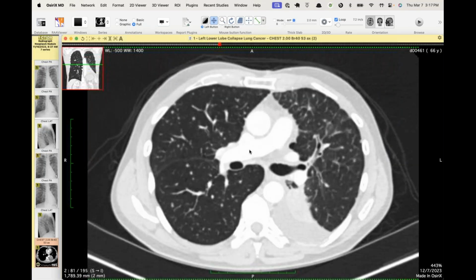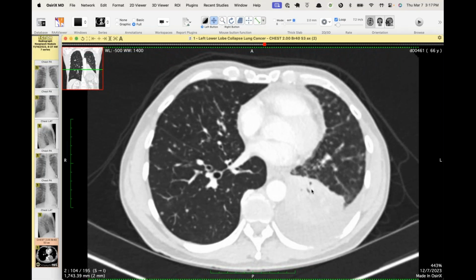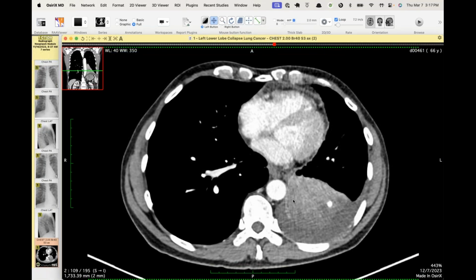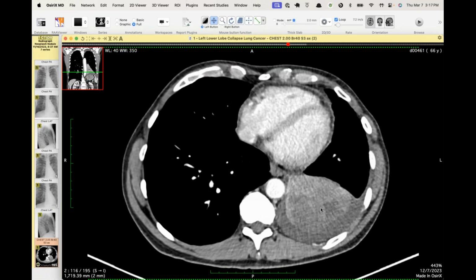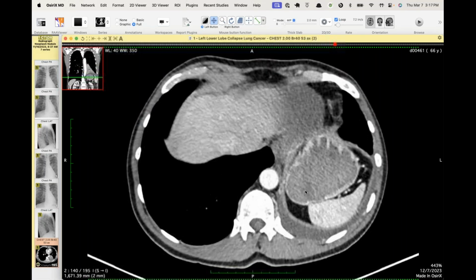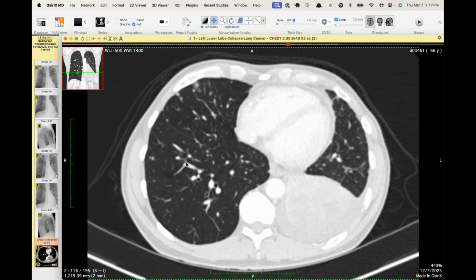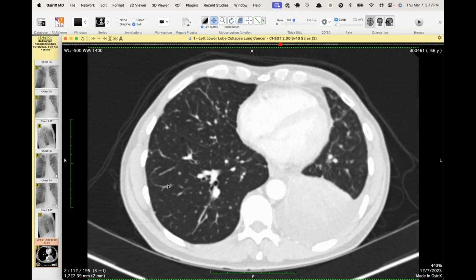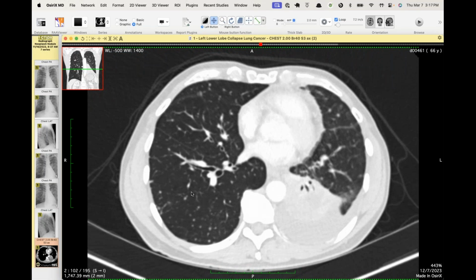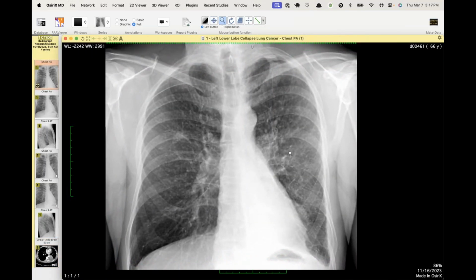One of the things that's a little interesting here is the lesion isn't actually obstructing the left lower lobe bronchus, which I thought was kind of curious. It's more of just a tumor involving the basilar segments, as you can see here. So the bronchus itself is actually open, but the pleural fluid was positive. There's not really much discrete nodularity there, but they obviously have stage 4 disease and M1, at least M1A disease from the intrathoracic metastatic disease with nodules on both sides. So a nice companion to Howard's case. And I think this, once you've seen it a few times, should just be instant pattern recognition.